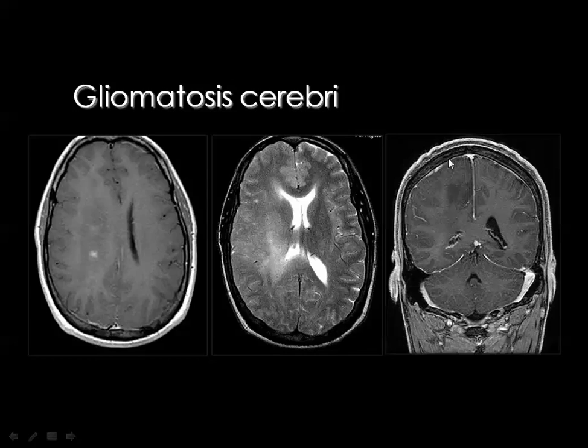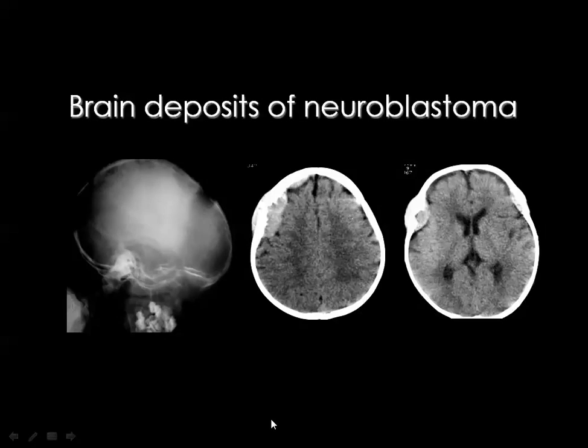Metastases in the pediatric brain are not commonly seen like those metastatic deposits in adults, but in cases of neuroblastoma, for example, which is one of the lesions commonly seen in our practice, the metastatic deposits have certain definitive criteria, being located at the suture line, and they result in marked widening of the suture.